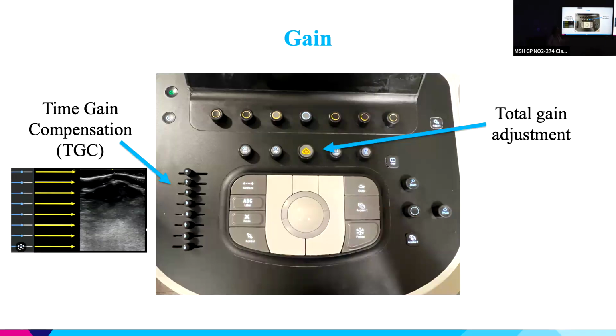And so a lot of times when you get the artifacts, especially if you're trying to do 3D of the mitral valve, remember that the artifacts usually are the top 2 or 3 rows. It's not uncommon that I will decrease those when I'm doing a 3D on pretty much everything. But make sure that you don't decrease them to the point where you're decreasing the resolution of what you're actually trying to image. The total gain, I pretty much almost never touch unless I absolutely have to. And when I do touch it, it's usually in the stomach to increase the total gain at that point. But usually I use my TGCs if I can for the entire study to optimize my gain imaging.